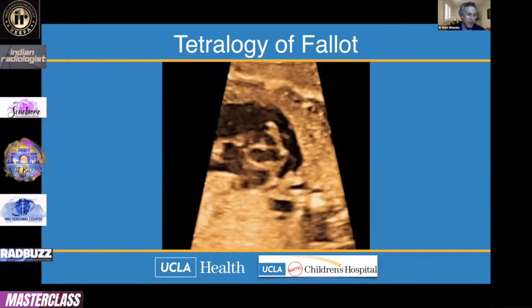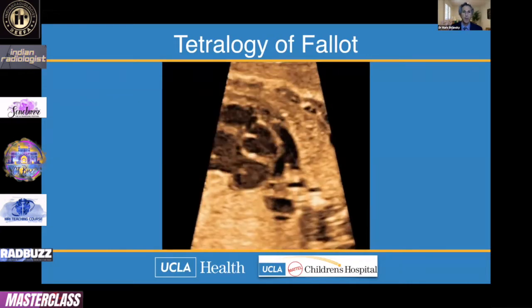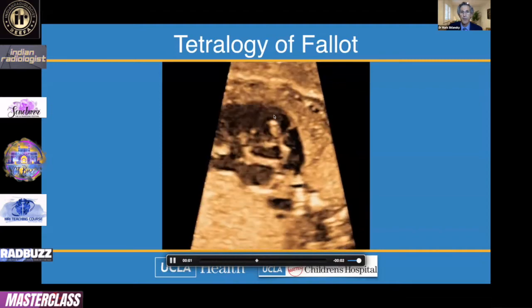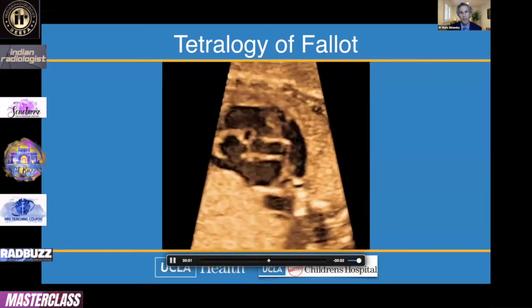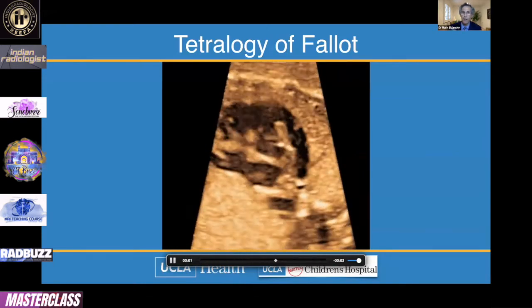Another view that I find, as a cardiologist, we like this view because we can start looking at some of the anatomy that really can have important implications for prognosis. I also like it because you can actually see the conal septum deviated anteriorly and rightward and superiorly into the right ventricular outflow tract here, causing the VSD here. You should know right away it's abnormal because the aortic valve should never be bigger than the pulmonary valve. And here it's much bigger than the pulmonary valve. You can see the pulmonary valve may be a little thickened, but you can see the main pulmonary artery. You can start to see it bifurcating. We don't know if it's bifurcating into the RPA and the LPA or the LPA and the ductus, more likely, but we're only seeing a bifurcation.